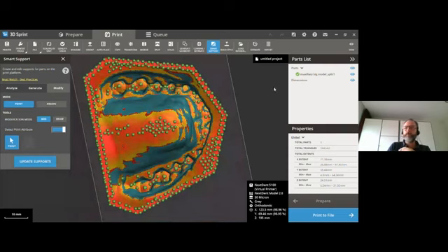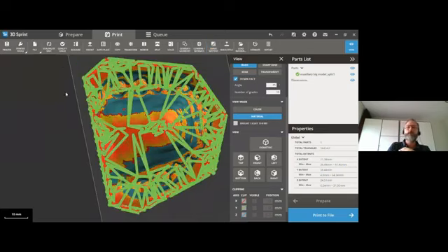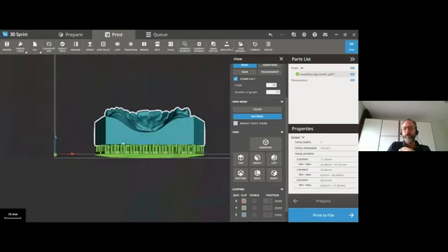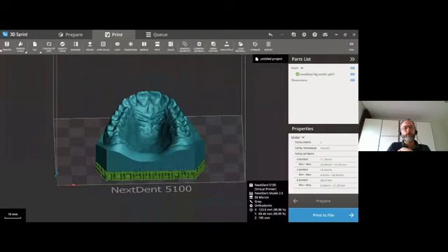So the down-facing surface that we have here under the view window could help you if you have removed supports and if you want to replace supports, where you should put them. But again, please trust smart support. It's a very nice tool. A lot of people have done a lot of work on this to make this functional. So I think it's one of the nice features that we have within the software, because actually you can go from selecting the material, importing a file, orientating it into the right direction, select smart support, and within a minute or two, you are ready to print.